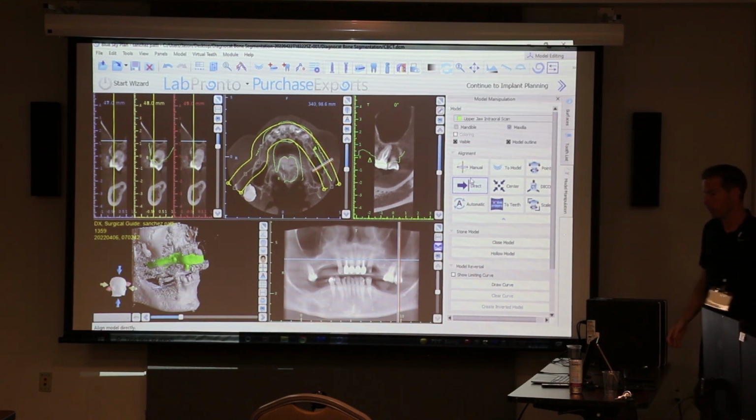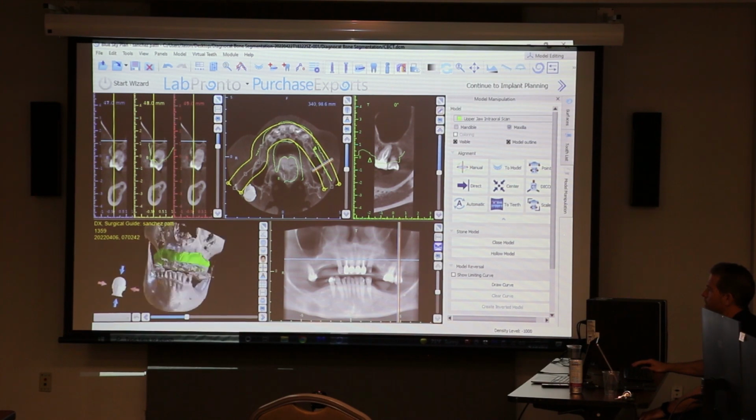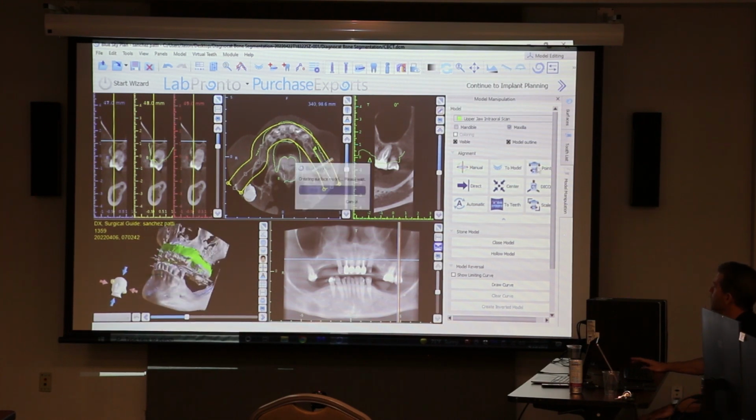And so just like what we had done before with that other model, we're going to kind of slide this to get some of that scatter out of here, at least some of it, right? And then I'm going to hit the points. And now I'll be able to give it some points where I can click equal points and actually tell it to line up there. And then we'll go reconfirm it, and you'll see how much better it does.